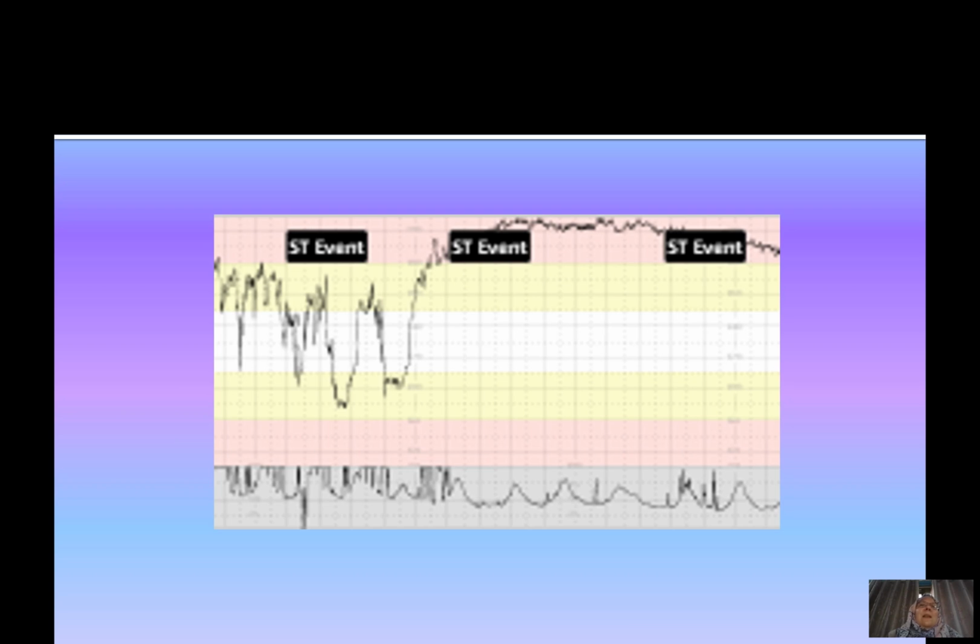Okay, so in this baby, you have to have a look what happens down the line. So we should have a look at the longer CTG, but the second half of the CTG represents a fetal tachycardia. The variability appears slightly reduced in this stint of the CTG, and it would depend on how quick this CTG recovers, if this can be tolerated and observed, or if it should be requiring immediate action.